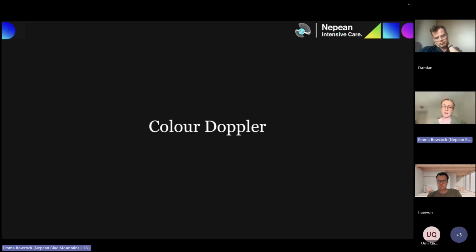Yeah, very nice. So 2D, I think we all can rush a little bit when we're starting to move from that basic to more intermediate and advanced level, hurrying to want to put color on and do multi-D imaging and use Doppler and things. But you can get a lot of information in your diagnosis a lot of the time from 2D, obviously not severity, but you can get a pretty good idea that you're going to be dealing with severe if you've got a big flail leaflet or something.